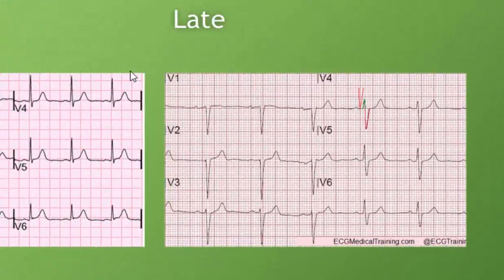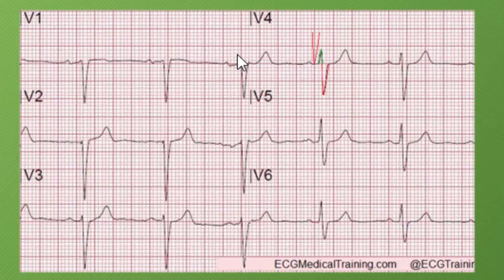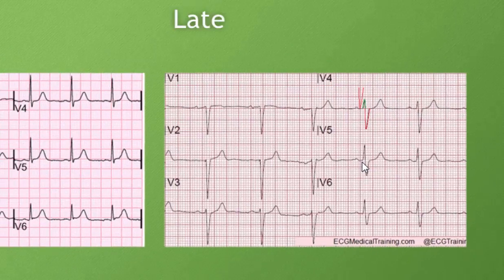And then you take a look over here at the late QRS transition, where it becomes positive after V4. So again, I measured here. If you see the negative QRS is taken against the positive QRS, and it is still negative in V4. V5 looks pretty neutral. You might have to take the area under the QRS to figure that out.